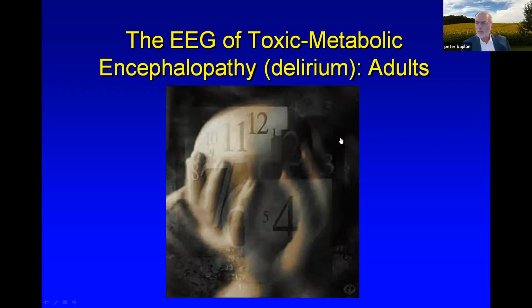So they're just probably different words used to express the same thing. The classification for EEGers shows that the suppression between those bursts is less than the measurable 20 microvolts. The bursts, though, typically they're high voltage, but they can be any voltage, any frequency, and any morphology. But it's that sort of on-off aspect of being suppressed and then having bursts. You can have bursts without marked suppression between. You can have bursts on normal voltage background.